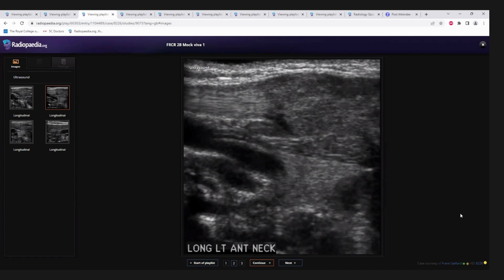You do not aspirate this, please. This is what they want to know, because this is going to disappear on its own within 4 to 5 months. So the patient will present with torticollis. He will give a history of obstructed labor, of breech position, of forceps delivery. And when an ultrasound is done, you see that there is a hypoechoic structure. It will also have flow. But the striated appearance of sternocleidomastoid is going to be distorted. Do not give it as a mass or a hematoma to be aspirated. The management is conservative. That's the only reason why they ask you this case. It's conservative management. Okay, doctor?